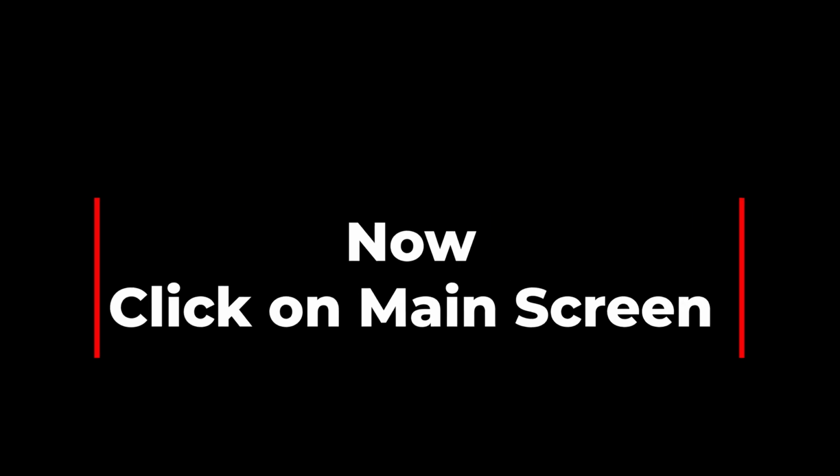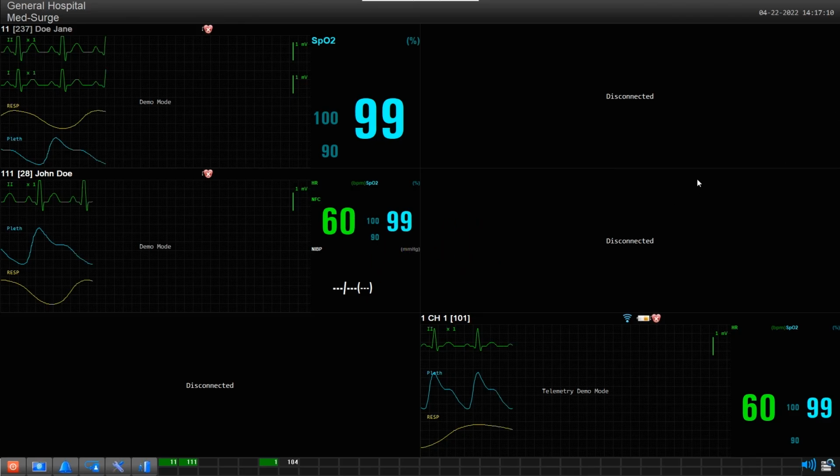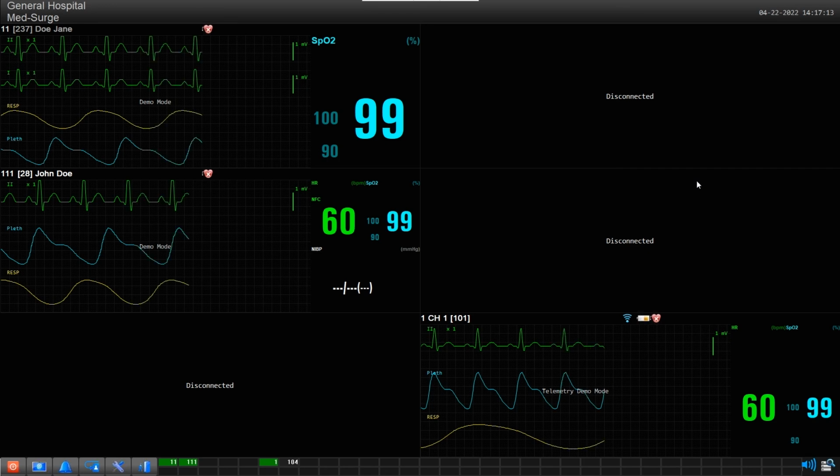Now, click on Main Screen to close out this menu, and return to main viewing status.